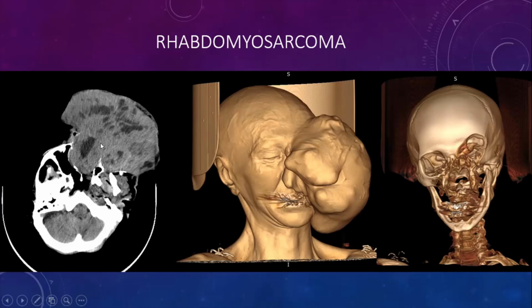And this is an axial CT scan. But the color images we are seeing are volume rendering images. In one shot, they give clear images of how the facial dysmorphism is noted here. And this third one is again a volume rendering image, removing the soft tissue and presenting only the bones here, with the bone erosions severely noted.